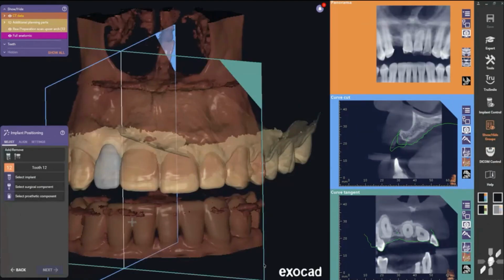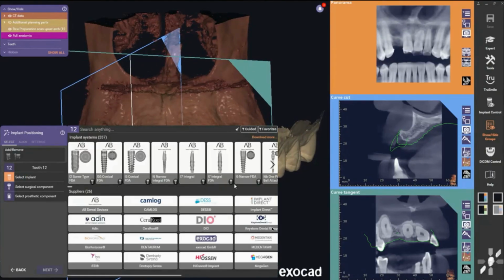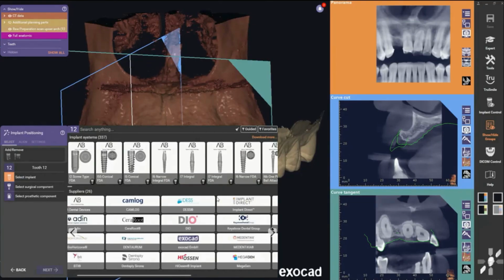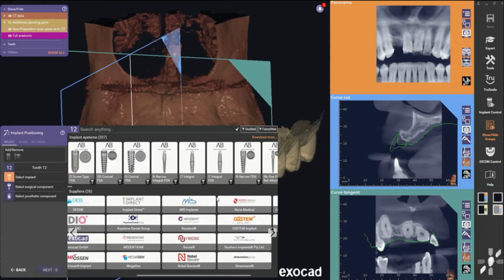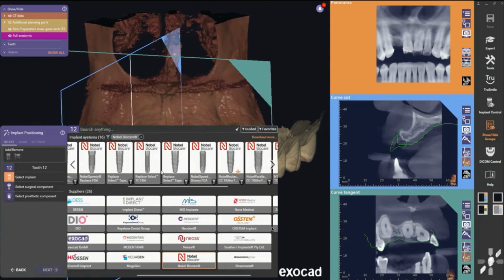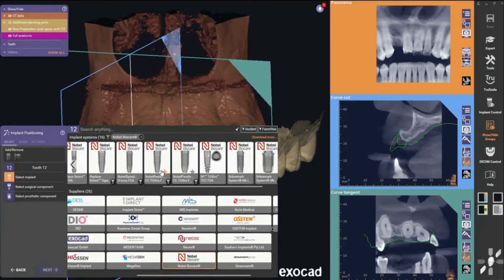So then once we have everything lined up, just make sure. So then, as I mentioned, we have a full library that's available for all the current Canadian systems. There's always a little bit of digging with any of the new ones that are coming out, or patients that have been treated in the rest of the world and they arrive in Canada. And this happens probably more often than you think, where they've arrived and we're trying to identify an implant.